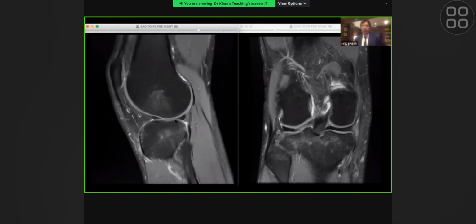Right, so that's a good attempt, but of course it's less than half the attempt you would expect in an exam situation. There are lots of findings that you need to pick up. And of course, in an exam situation, we completely understand there'll be lots of pressure on you, and because of that pressure, there's an urgency to quickly run through the images. Remember, in most exam situations there'll be multiple findings, and you have to correlate everything together in your mind. That's what we always tell our registrars.